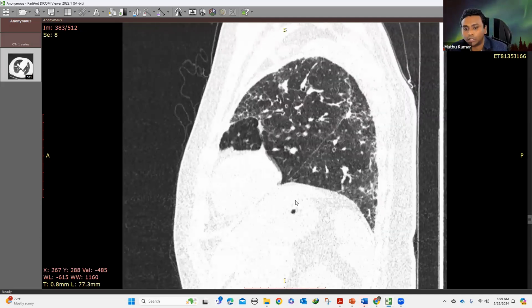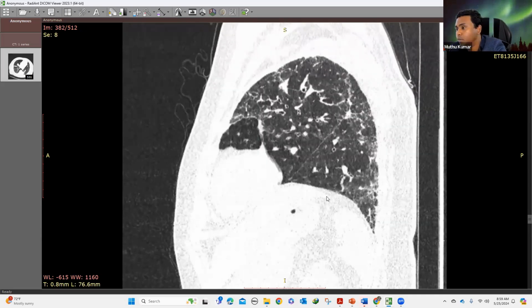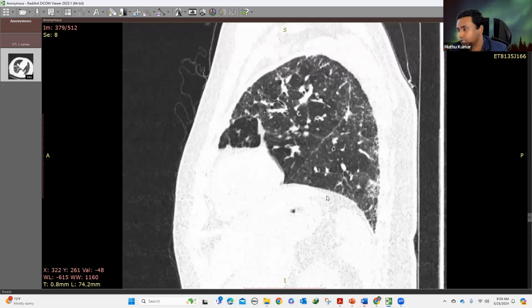That's what I use, not just the presence of the AP diameter or how the diaphragmatic positions. Look for evidence of architectural distortion. If there is architectural distortion, that is volume loss. That's how I differentiate, because these things are dynamic.